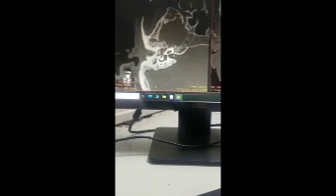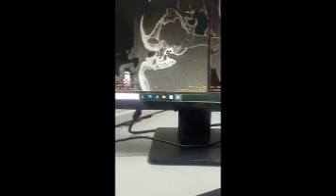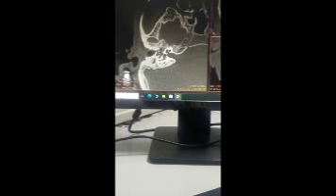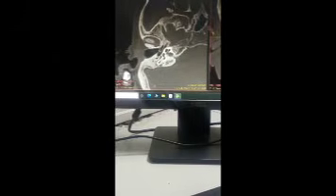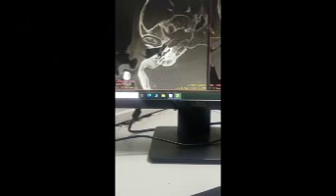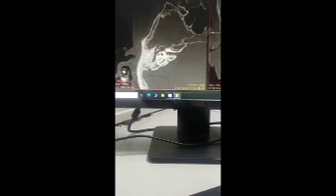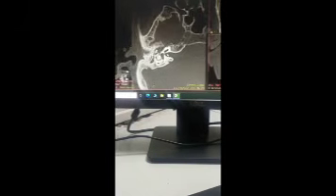So this is the lateral semicircular canal, this is the vestibule, and above the vestibule this structure is the oval window. Oval window, vestibule, lateral semicircular canal. So you will tell me which bony structure is attached to the oval window. We have learned in our ENT that the footplate of the stapes is attached to this oval window.